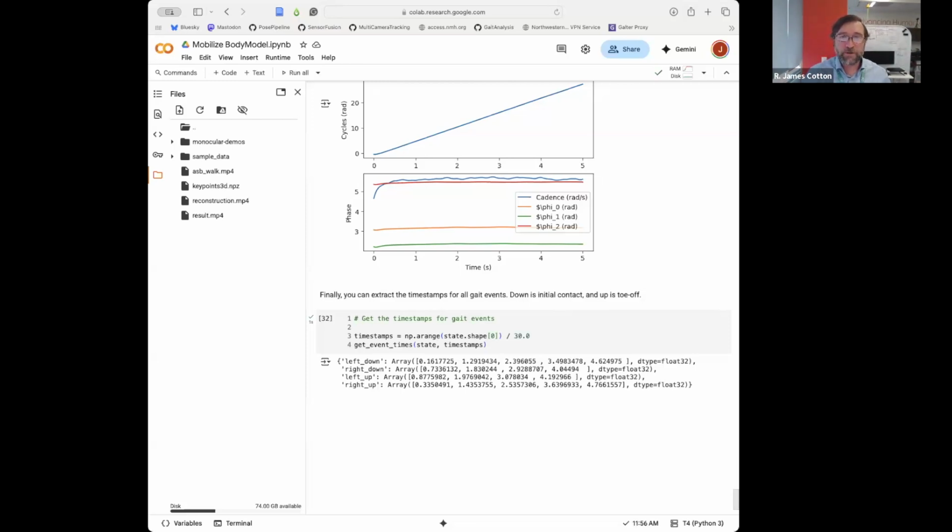In the scatter of the 3D scheme with the skeleton next to it, are those all of those 70-ish key points being output? Oh, it's more than that. MeTRAbs puts out 550 key points or so. It puts out the superset of all of the 3D key points that existed in the training corpus they used. We select the 87 subset that was used in the MOBI dataset because we found those were sufficient for biomechanics. I would absolutely discourage using the 25 key points from COCO. It's not sufficient.